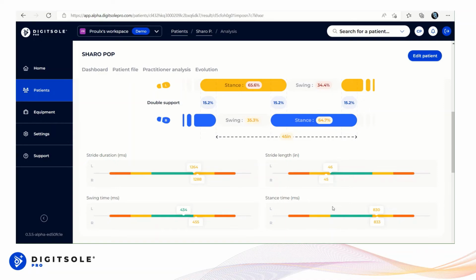So the opposite side, especially if we see that that is in the red on the short aspect, could be because of pain or limping. You don't want to spend a lot of time. Or if there's a weakness, could be longer contact time on that weak side because they don't have the ability to turn that step over quite as quickly.